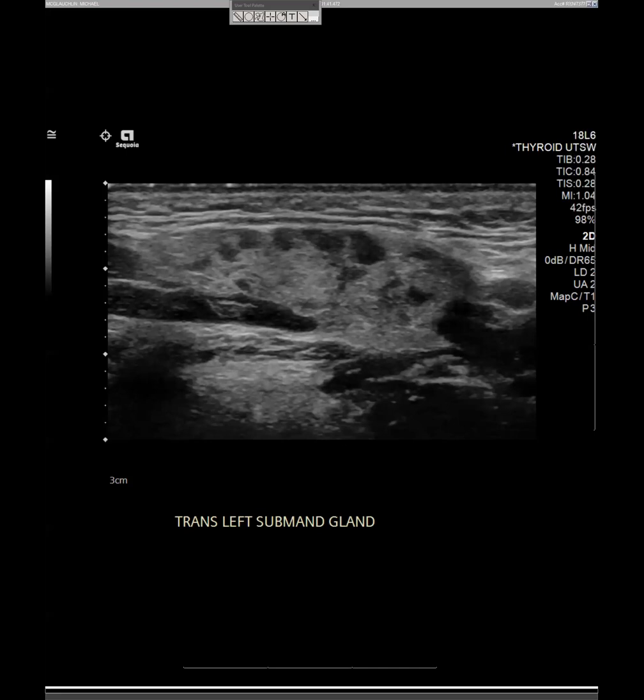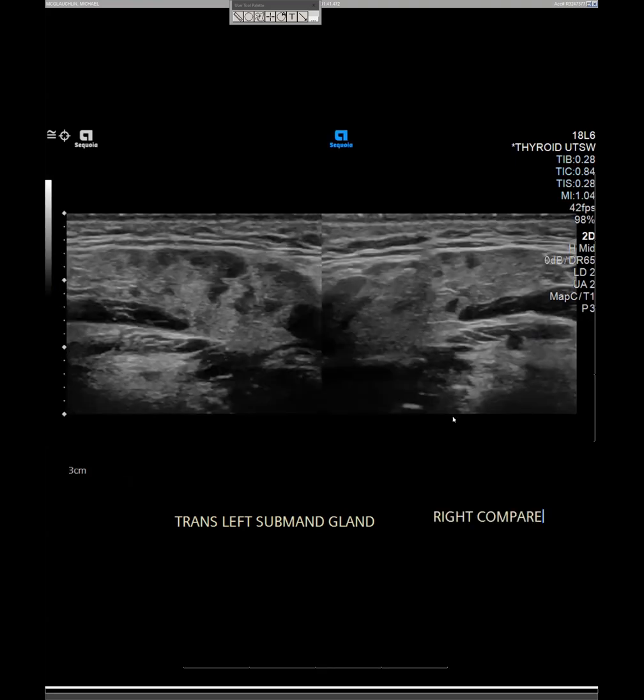Yes. All right. For right now, history is withheld because it's kind of an Aunt Minnie, especially if you know the history. But history of left submandibular gland swelling, fluctuating in size with antibiotics. So this is a side-by-side of the submandibular regions, left and right.